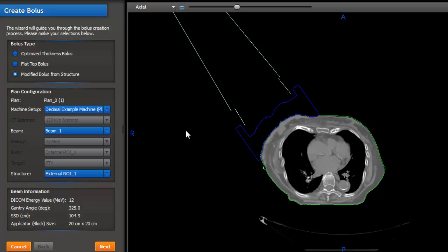You'll also need to create the beam in the treatment planning system on which you want to convert this. If this part isn't associated with a beam, chances are good that it may not convert properly within the P.D software. So if it's not actually associated with a beam, it's typically not a good candidate for modified bolus conversion. But you may try anyway. In that case, you may want to just produce a beam that is as perpendicular to the bolus as possible in your treatment planning system.